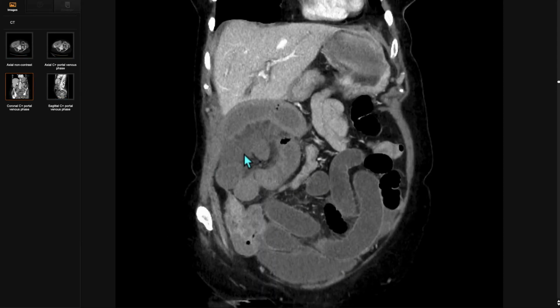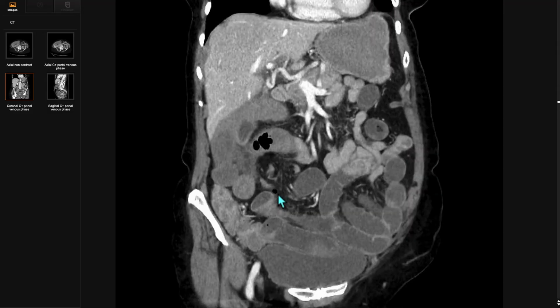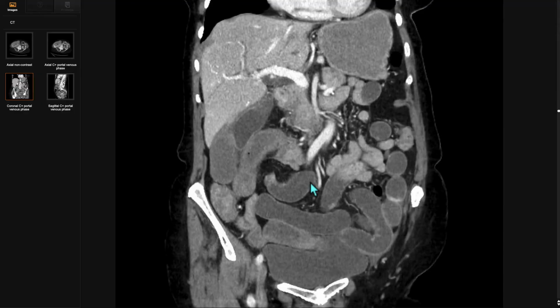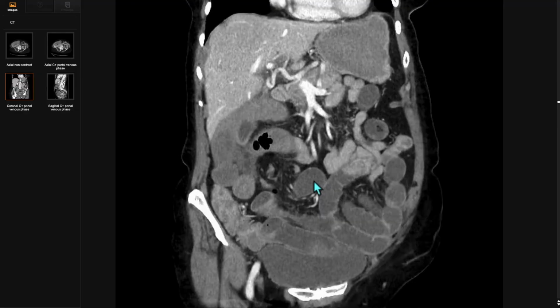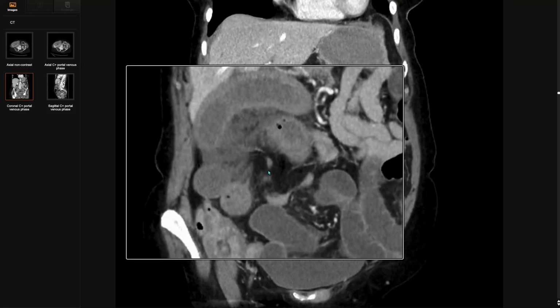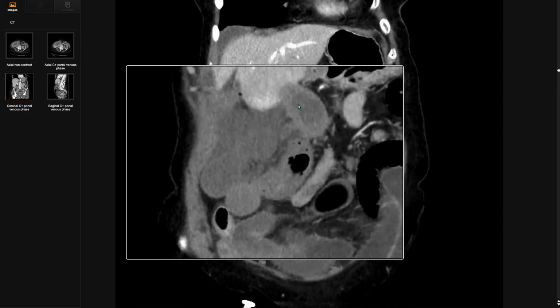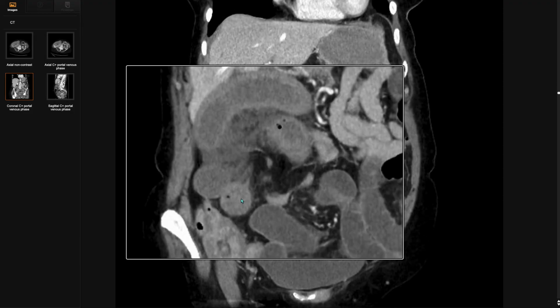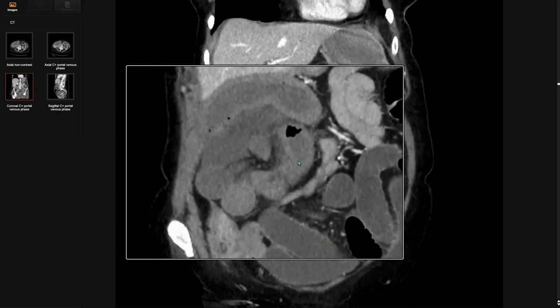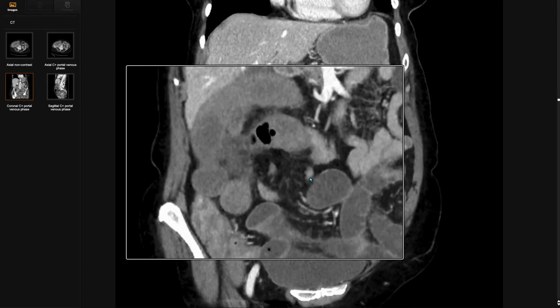This next case is less of a mystery in that there's significantly abnormal small bowel within the right abdomen. The upstream small bowel is quite dilated, making it a little bit difficult at first to evaluate the transition points, but skipping ahead here, we can follow this dilated loop across midline to the first transition point into this closed loop here, and we'll scan through and follow the rest of that small bowel out of the closed loop right here as it dives backwards into decompressed distal small bowel.